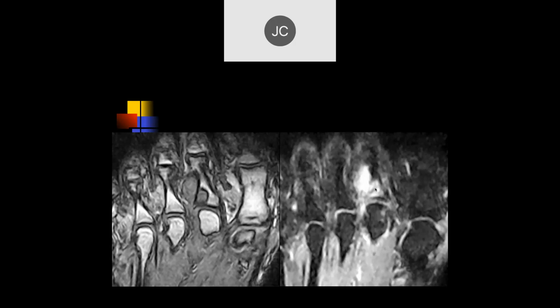This is actually a bit atypical for rheumatoid arthritis, though I'd certainly think about it. Rheumatoid much more commonly involves the metatarsal heads in this location, especially the second and third. But certainly put it in that category, and you need the rest of the clinical history. But once you get distal to the metatarsophalangeal joints or metacarpophalangeal joints, it's called more peripheral disease.